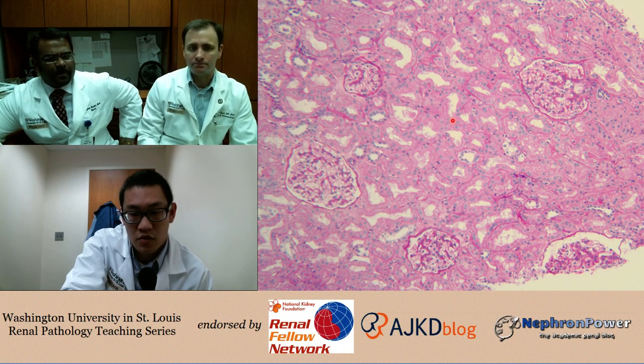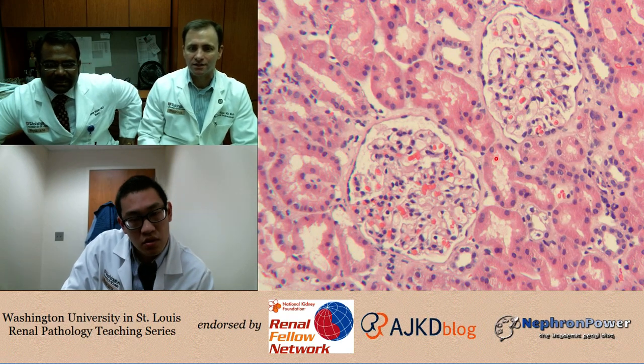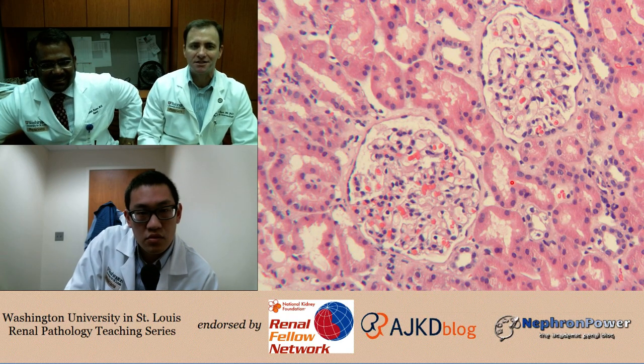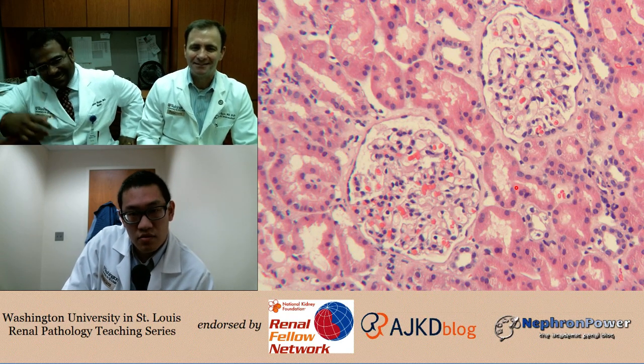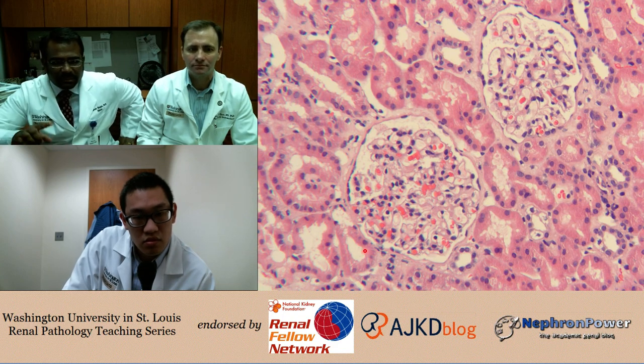All right. Ready for the next image? Yes, let's move on. Okay, good. Now, what stain is this, Raj? So this is an H&E. This is the H&E. Very good. Excellent. Numerous cells. All right. So again, looking from outside in, looking at the tubules, they're back-to-back open.